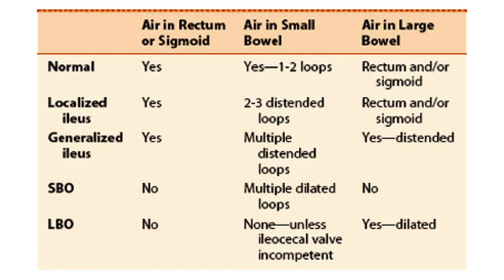For the large bowel obstruction, there is no air in the rectum. There is no air-fluid levels or small bowel dilatation unless the ileocecal valve is incompetent. Okay. That's very important to know. And the last, bowel dilated.